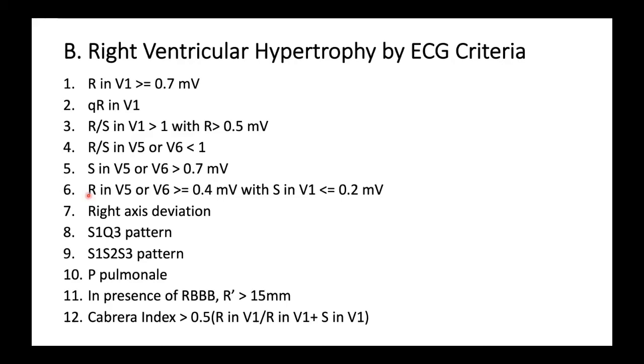progression of the R wave, then you know there is something known as dextrocardia. In dextrocardia, aVR is positive and the P in aVR is positive, and you have a reverse progression of the R wave. So that is known as dextrocardia, where you can get a tall R in V1.